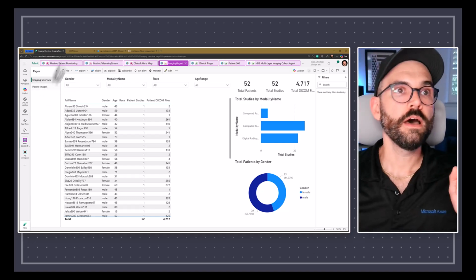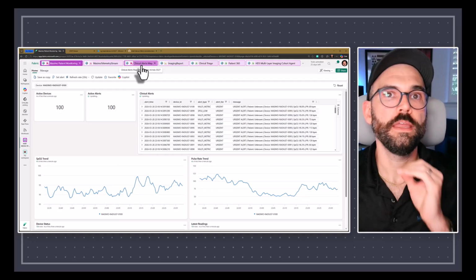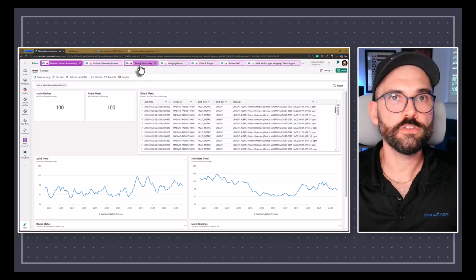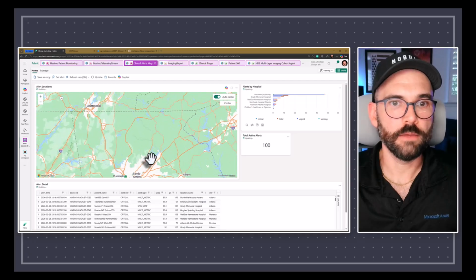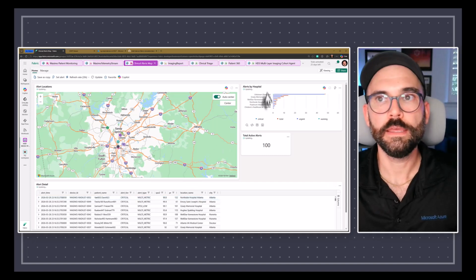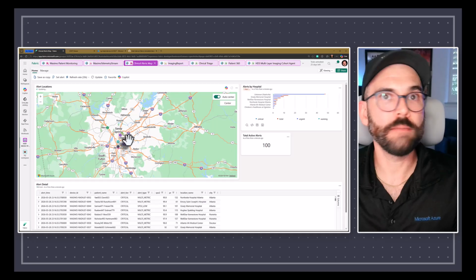I have a few pieces of information that are live and streaming, and then I have a few pieces of information that are batch and have been sent over from our EHR, like Epic or Cerner or something like that. And these two things are the live bits. So I am getting live information about devices that are alerting me about low blood oxygen levels and high pulse rates. And they're showing at different hospitals or where they may have been admitted before. So from here, I can see where on the map I'm getting alerts from.